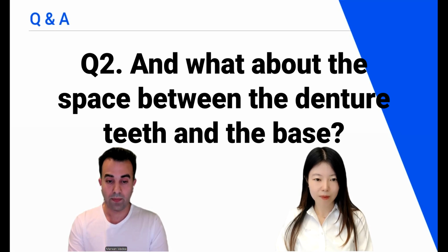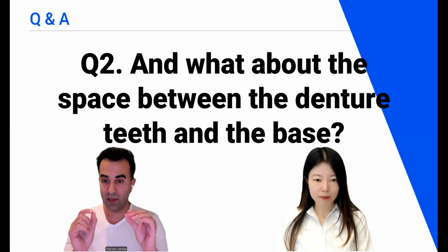Regarding the teeth, I made them 1 millimeter above the gum when I offset the edentulous mesh and did a Boolean cut. And in fact, it's less than 1 millimeter. To be precise, in this example that I demonstrated today I provided 0.8 millimeters because I left a relief of 0.2.